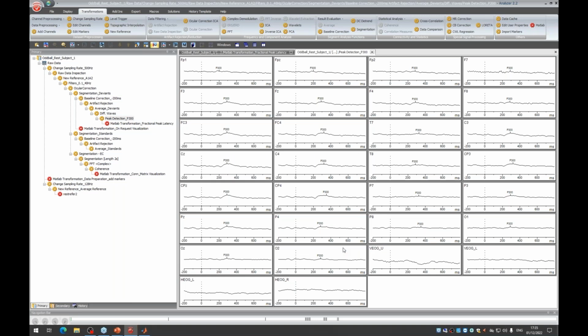So now the data will be transferred to Matlab from Analyzer. Once the data is sent to Matlab, a dialog that I have shown you in the introduction will appear. Please try to resist and do not click OK until you are sure you are ready to close Matlab and start the re-import phase.